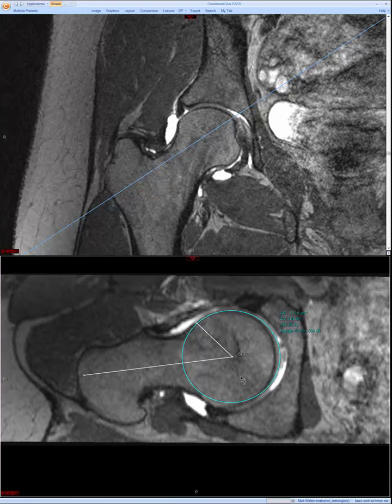Before I forget, I just want to mention that a lot of people are walking around, myself included, with these impingement features, and we don't necessarily have impingement. So remember that hip impingement is a clinical diagnosis, and we're simply assessing for features that may predispose a patient to impingement. Also, one may not have any of these features of impingement, yet may clinically present with hip impingement as well. So not having the features does not preclude the clinical diagnosis either. Okay, so that's the alpha angle.